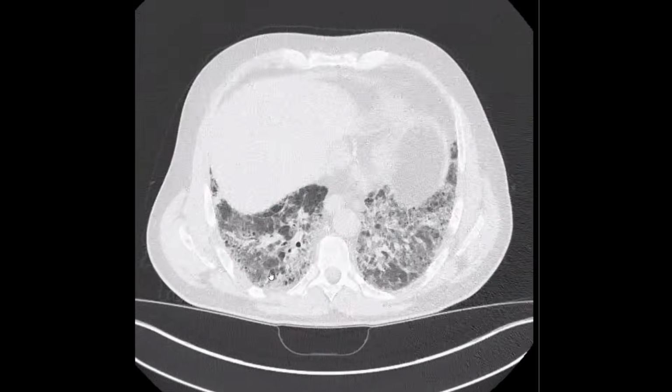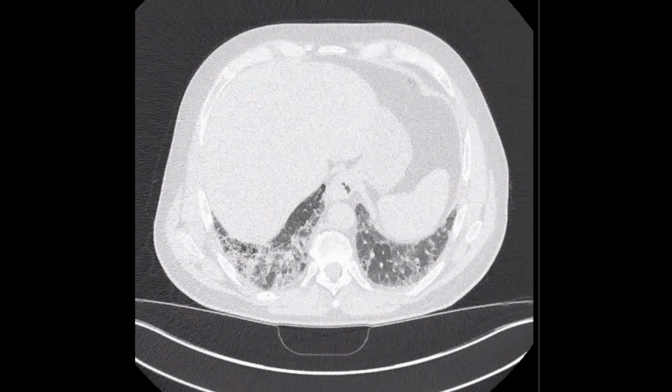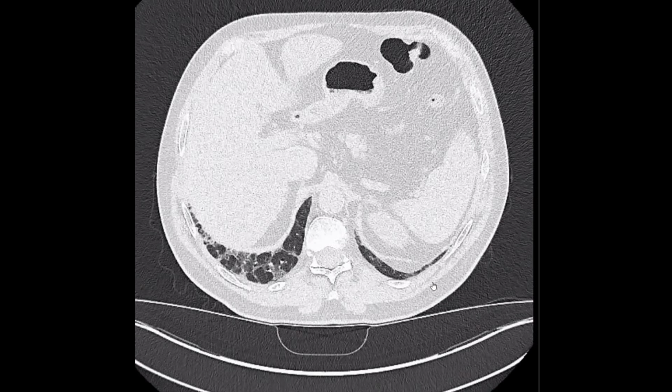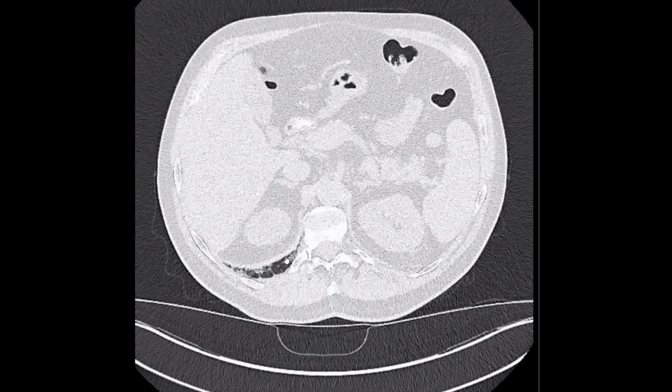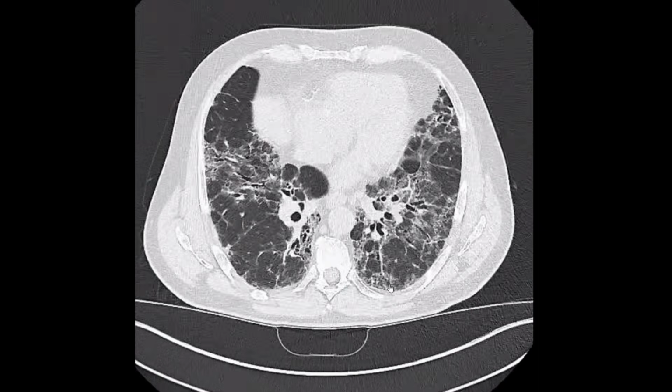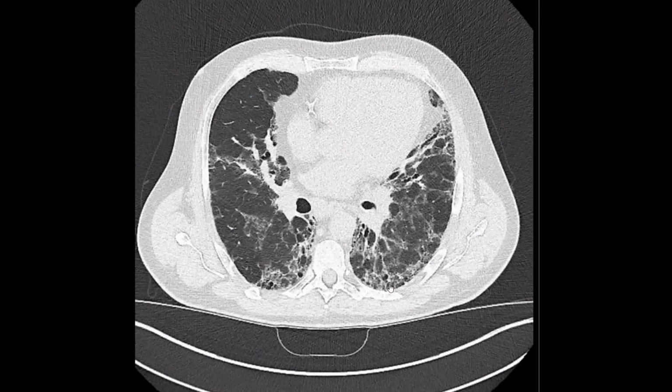Especially, I want to tell you something also very important in this case. Look at the lower costophrenic recesses. They are spared. Look for this one. It's more or less spared, not like those areas. Now, I think we enumerated three diseases in the chest sparing the costophrenic recesses. Can you help me?